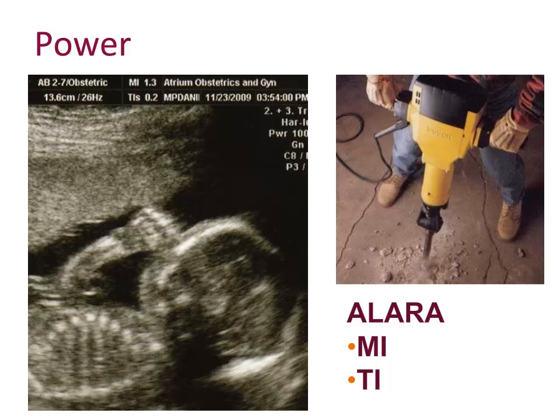It is important to know that very high voltages are needed to produce diagnostic ultrasound. This voltage can pose a risk to the patient and to the operator if the ultrasound transducer is damaged or cracked. But other than that, ultrasound is pretty safe, right? If it's good for a baby, then it must be good for you as well, right? I would have thought so if it was not for the thermal index, called TI, and the mechanical index, called MI, usually reported on the screen.